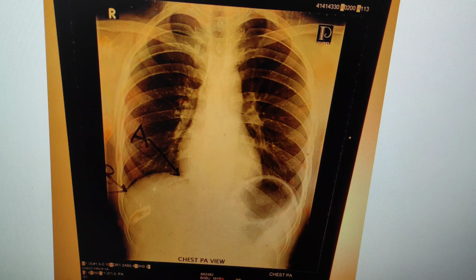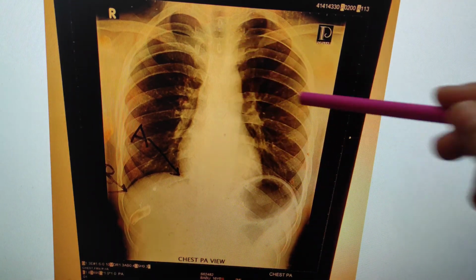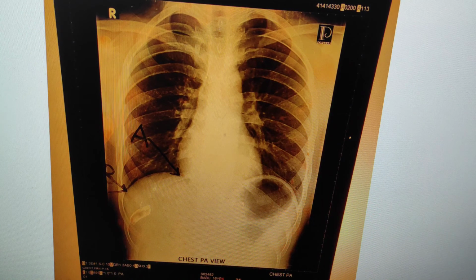Here I have discussed the normal plain X-ray of chest. When we take an X-ray in our hand, then we will discuss it like this: this is the plain X-ray of chest PA view showing radiolucent and radio-opaque shadow. The costophrenic and the cardiophrenic angles are normal and the cardiac shadow is present. The trachea is centrally placed. So that's all about the plain X-ray of chest.